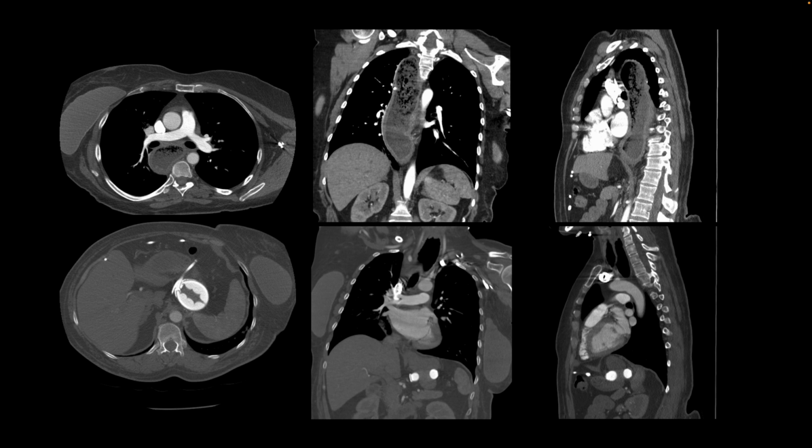This is our next patient, and here we see a finding which is similar to what we saw earlier on one of the cases, distended and dilated esophagus, narrowing towards the GE junction. Almost looks like the same patient with achalasia, except that more inferiorly, they have this gastric lap band which appears to be very tight right there. That is like the transition point and not allowing anything to go past it.